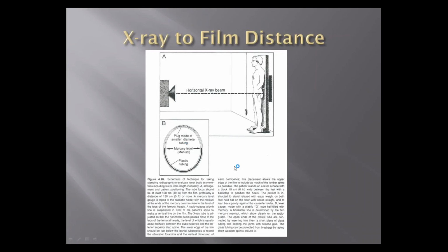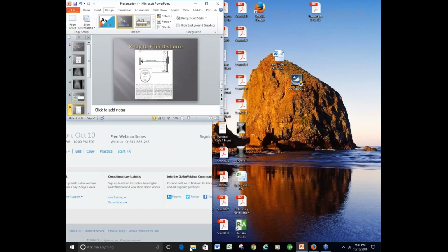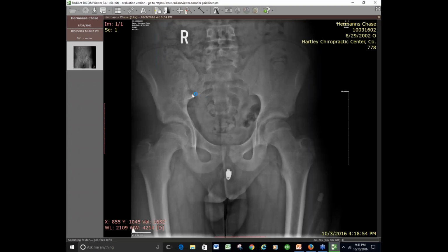Let's see. Get out of here. Yes, I know. Thank you. We're going to get back into that and open that up. So let's take a quick look at why that is so important. Okay, there we are.